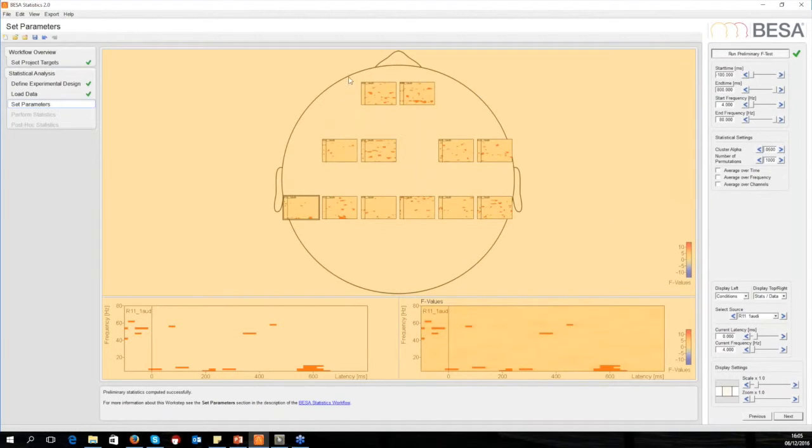So one thing I need to say is that we had 6 different sources in this source model, one in the prefrontal cortex, one in each side of the auditory cortices. We had a couple of other sources as well that had some suspected activity. And each of them have 2 orientations, since we have an MEG data set here, so we only need 2 orientations for each regional source. So these 12 sources are plotted here.